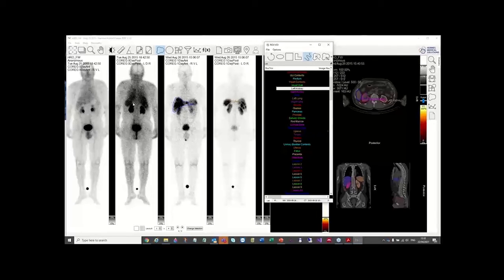And then I think a left kidney and a right kidney as well, and maybe either this view for those. I'm sorry, these regions are not very good. I'm sure there's expert region drawers out there who are shocked. Oops, that was the left kidney again. Okay, let's do another one of those.